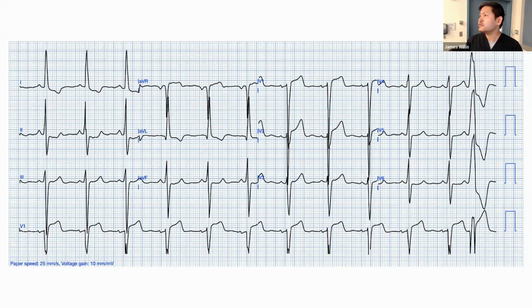One thing that might help you, if you're lucky and have it, is to look at old EKGs. If you see an old recent EKG that looks the same, that makes you feel a little better. It doesn't mean that if they're having chest pain you won't still get the enzymes, but that makes you feel better. The other thing I wanted to mention is the LVH in V1 and V2.